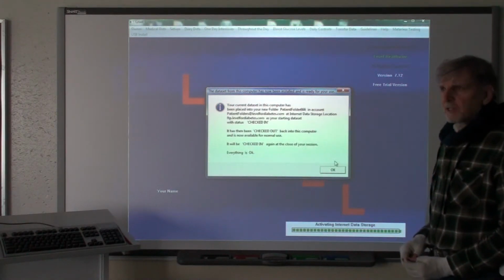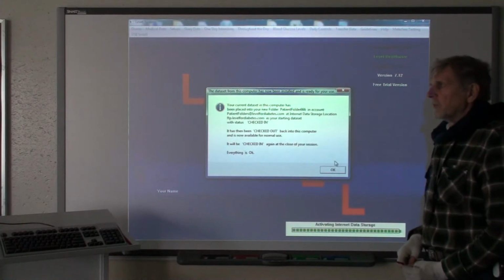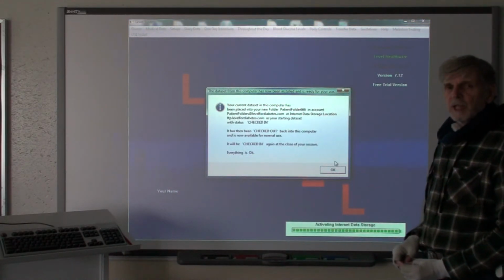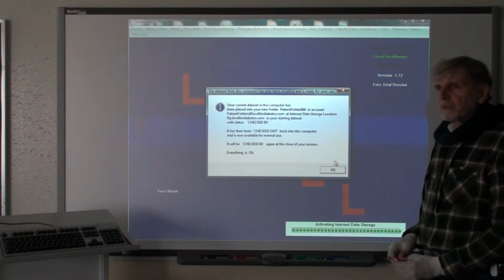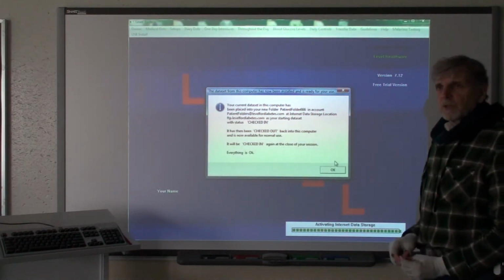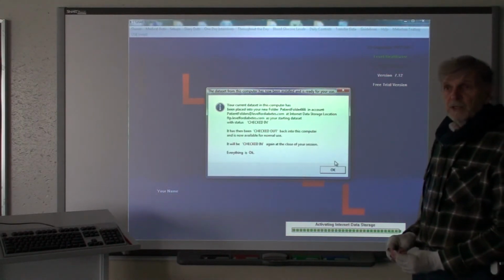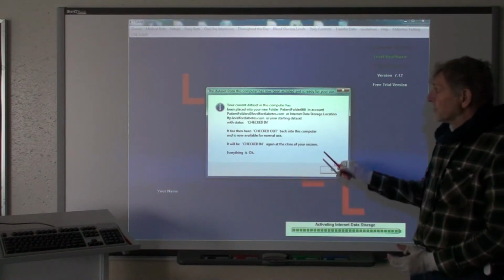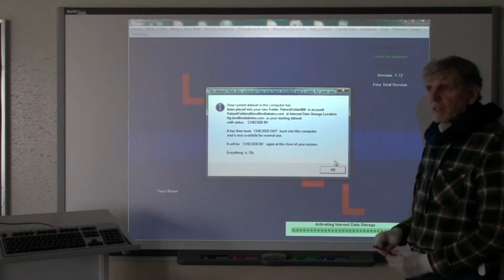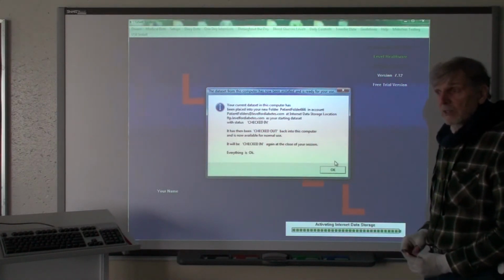To ensure data integrity, while you have the data set checked out, then no one else can also check it out. Not another computer or your diabetes caregiver or anyone else. Because if two of you have it checked out at the same time, then you will be overriding each other's data. So for the moments that you are actually using the data set, this is the only computer that can have it in checked out status.